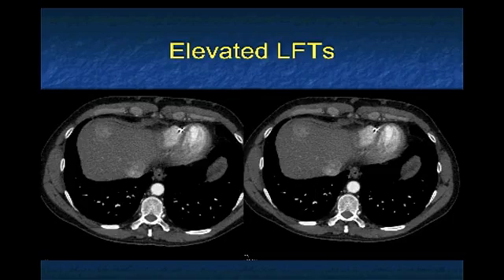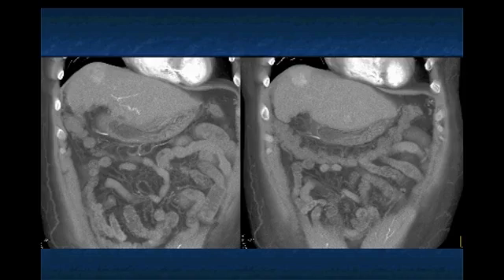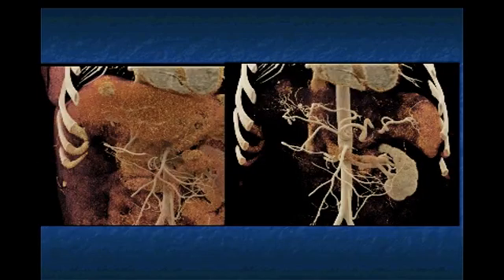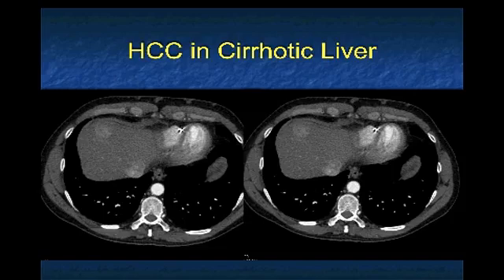Elevated LFTs. Vascular lesion, dome of liver over 2 centimeters in a cirrhotic liver. Without looking any further, that's hepatoma till proven otherwise. There's some neovascularity nicely shown here. Here it is on cinematic, the mass, the neovascularity. No surprise, hepatoma. Really nice example with CR.